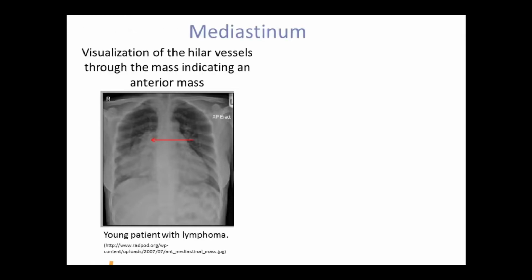In this section, we'll go over the identification of masses in the mediastinum. First, we need to ascertain that the mass is indeed intramediastinal. Intramediastinal masses do not contain air bronchograms and have obtuse margins with the lungs. In contrast, a lung lesion will create acute angles with the lung. The mediastinum is divided into the anterior, middle, and posterior sections. The middle section is comprised of the great vessels, trachea, and esophagus.